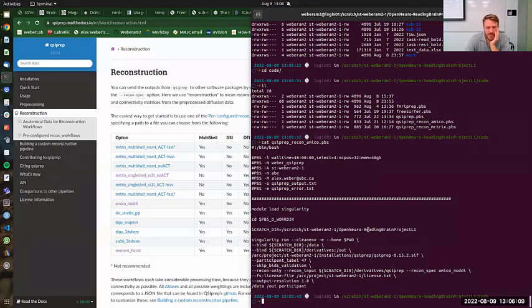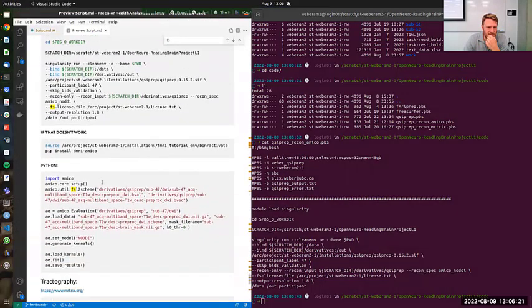And if you don't want to use Singularity, you could actually install NODDI yourself through a Python environment. So I'll show you that, but again, I failed to do that. That didn't work.